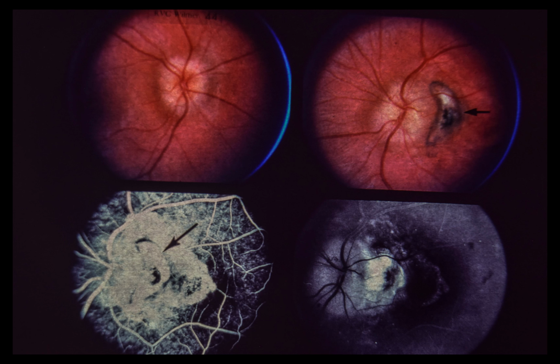Upper left. The right optic disc is elevated with a blurred margin, and there is no central cup. The retinal vessels are not obscured as they cross the disc surface, and there are no hemorrhages. Normal peripapillary retinal nerve fiber layer striations are present. Upper right. The left optic disc is also elevated, has no central cup, and has an irregular border. The retinal vessels cross the disc surface in full view. A small tortuous vessel is seen on the disc at 11 o'clock.